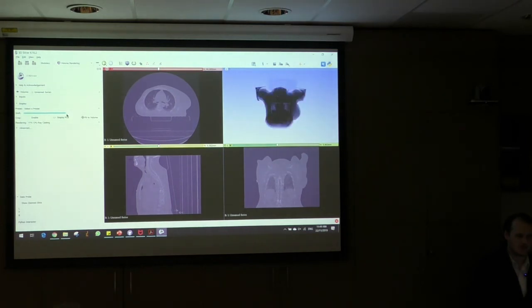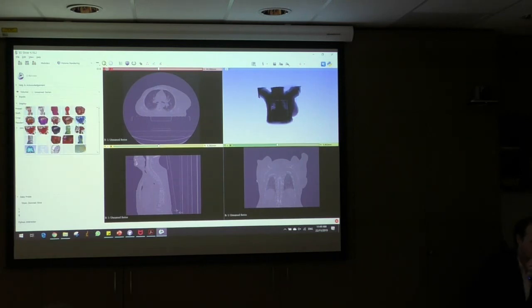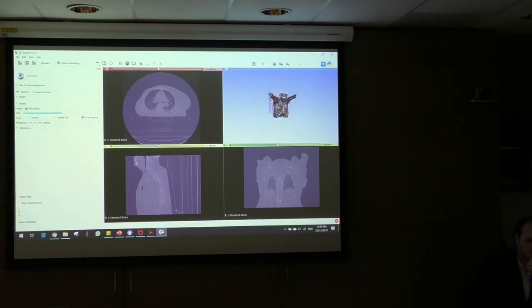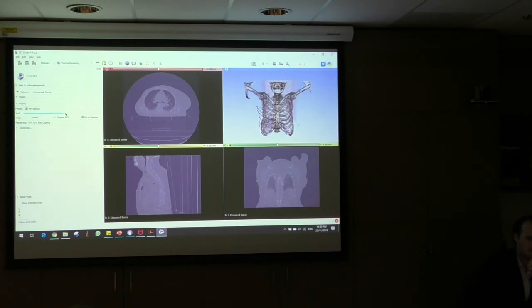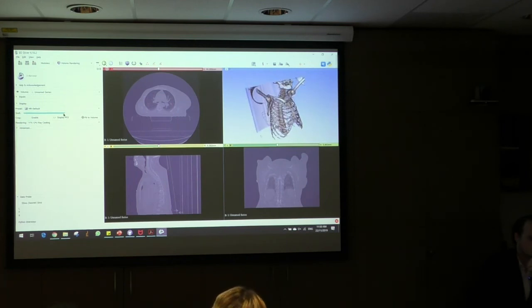And what you're starting to see is your formation, your 3D render of your patient, which is lying on the table, which is very clear. Additionally, we can also select from any of these components here. For instance, if we want to look at perhaps the bone, we can focus in on the bone, and we also get a little bit of textual information there as well, which is very handy. And again, we can use the slider to take a little bit more of that information away, so we can clearly see the bone information, or we can use the slider in the back to generate more of the muscle tissue that would be present in your patient.